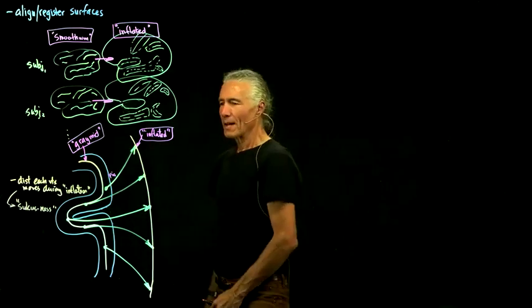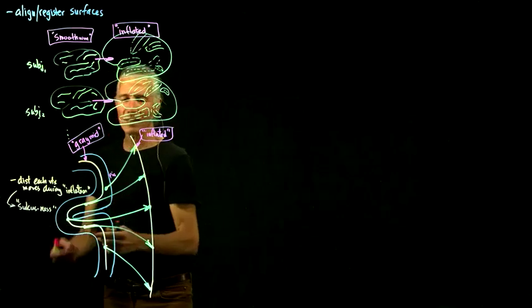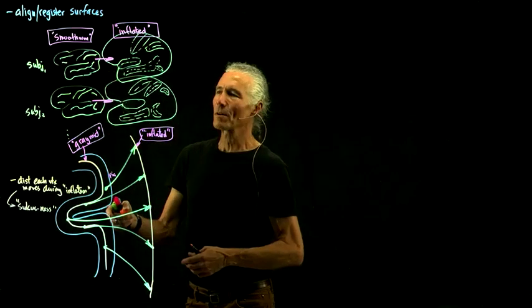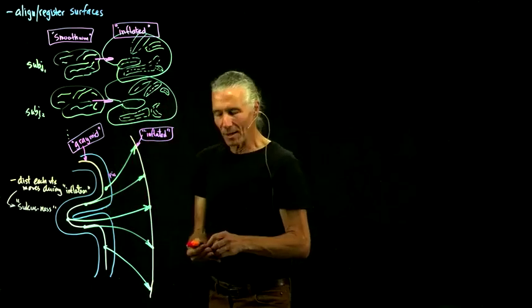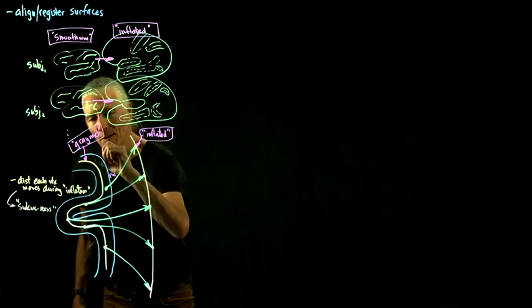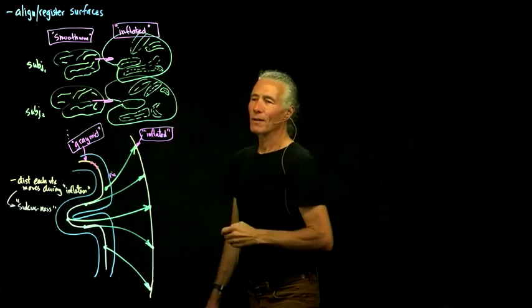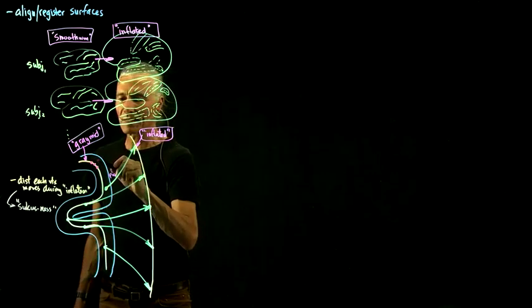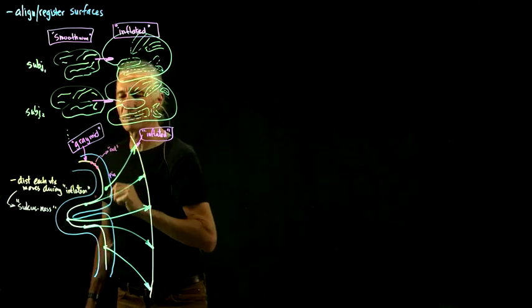number. And if you look in FreeSurfer, there are two different measures of the curvature of the cortex. One is the actual curvature, which you talked about last time. What was the curvature? That was looking at one vertex here and comparing it to its neighbors. If we do that, we can see that this central vertex is slightly out, so it's slightly convex relative to its neighbors.